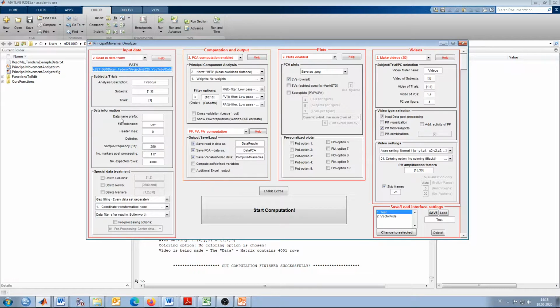The second step is to specify what type of data we want to read in. So here you have different options. For example, we have CSV files, as you saw just a few seconds ago, and then there's the option of, for example, deleting headlines, for specifying delimiters in the file. So what separates the data from the next data point.